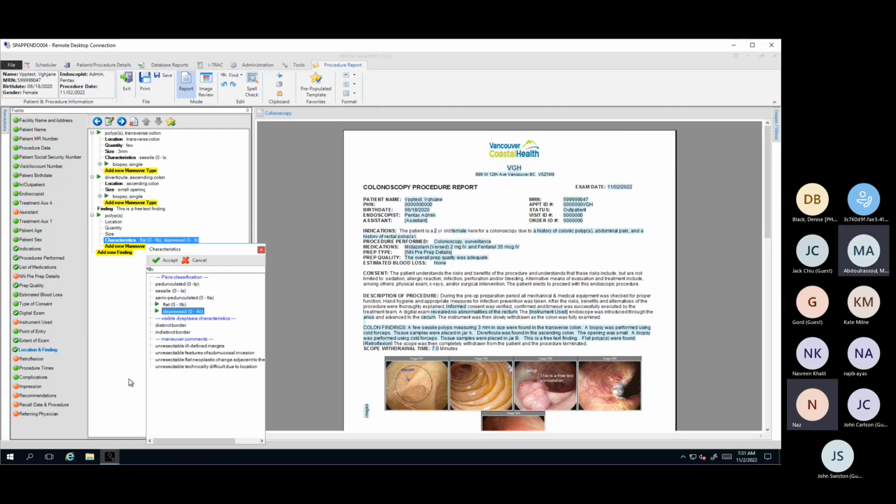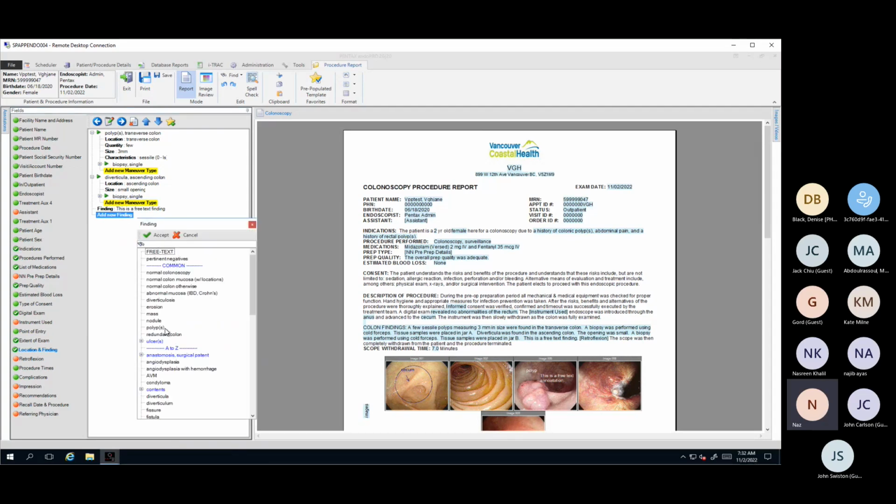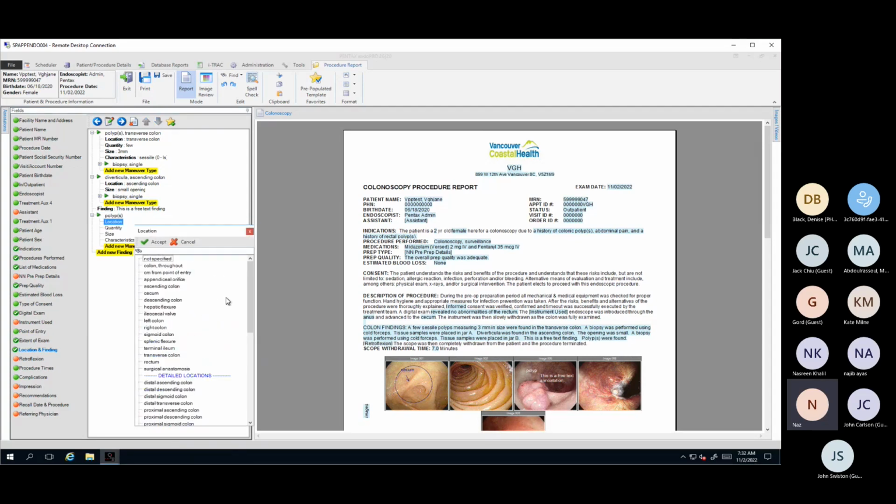One more question. Is there a way to annotate, let's say you find 5 polyps, one was Paris 1P, the other one was Paris 1S? Can you annotate it as number 1, 5 millimeter Paris 1P in cecum, removed completely en bloc, then 2, 3, or do you have to do it in flowing text the way you've done it?